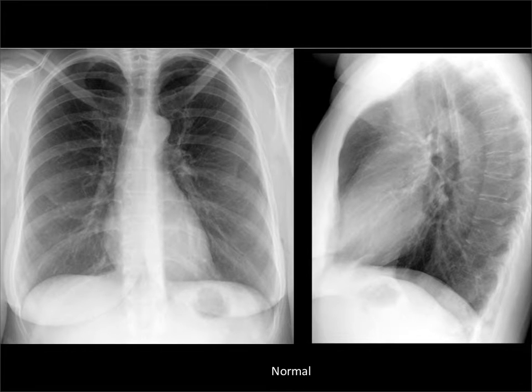Conversely, the right ventricle, which sits about here, we're not going to see bordered by the lung on the frontal radiograph, but it is bordered, because it's the most anterior chamber, on the lateral chest X-ray, and it comes up and fills up part of the retrosternal space. On a normal patient, if you measure the distance roughly between the apex of the heart and the manubrosternal angle, the right ventricle shouldn't take more than about a third of it. If it does, that is right ventricular enlargement, so it's going to enlarge to increase that space.